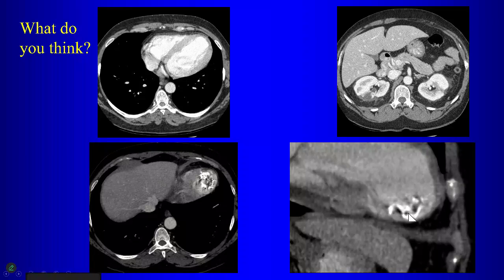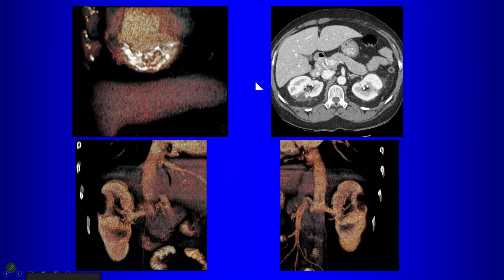So chronic thrombi can also calcify. And one of the complications of patients who develop thrombi within these aneurysms is emboli from the thrombi, which can result in strokes, which can also result in infarcts. Here there are infarcts to the kidney in this patient. Okay? So here you can see the volume rendered views showing you the infarcts at both kidneys in this patient. And here's a volume rendered view showing you the thrombus at the apex of the ventricle.